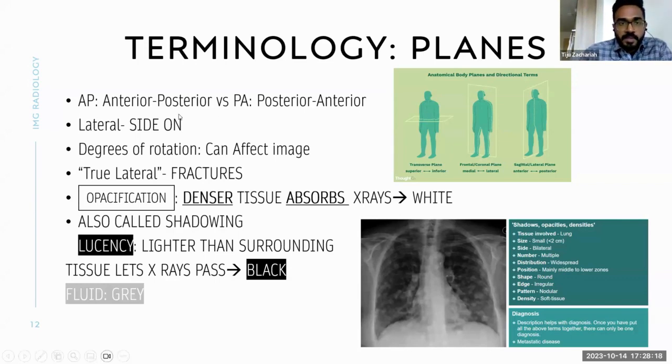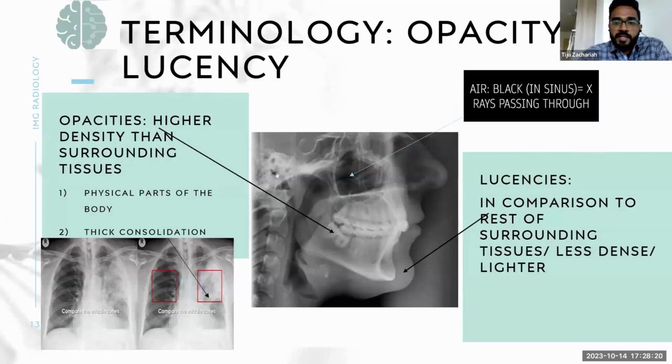Now, you can see a few X-rays kept here. Let me talk about the X-ray that is showing us the bones of the jaw, the teeth, and a bit of cervical spine. You can see this marked area, which is maximum black, obviously containing air, that is the sinus. Here you can see more white, which is the bone. And you can still see other structures there. This is the tissue that, as I said, is less white than the bone. That is how we can see different structures within an X-ray.